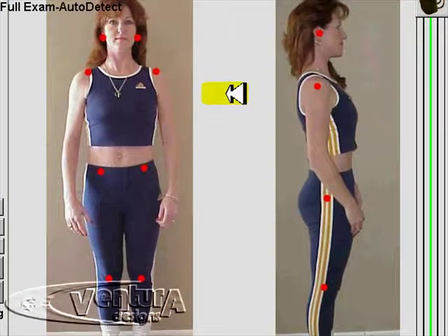I wanted to talk just a little bit about AutoDetect. By its very nature, AutoDetect is very discriminating. It must be able to distinguish one color value from another. This means that your pictures must be very, very good. The dot placement is critical. The dots on the shoulders must be facing more toward the camera.